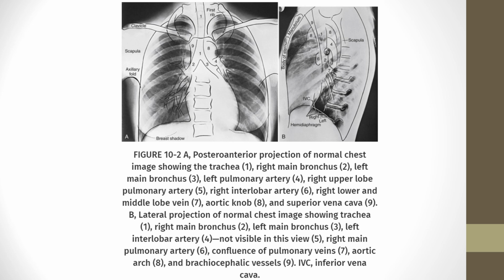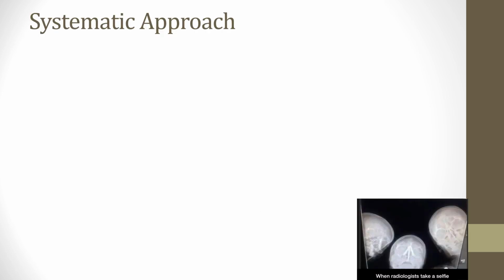The better you know your landmarks, the more you are able to benefit from their X-rays, because then you know exactly where you're looking and what you're looking at. You get more of a 3D image in your brain of this 2D scan.